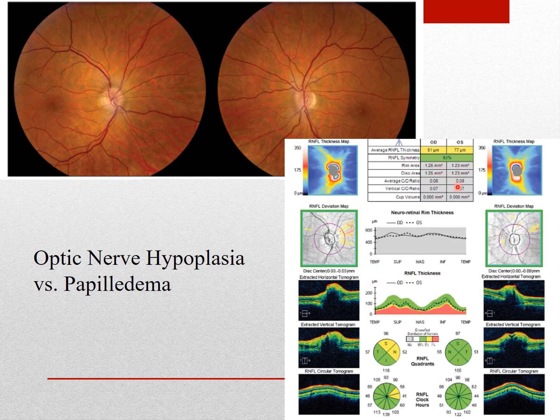Again, here, like I mentioned, everything's in gray, not enough data, because look at this, the disc is so tiny, insufficient data, everything's shaded in gray. Even the cups are tiny too, all right? So far, everything is pointing towards optic nerve hypoplasia. Look at the nerve fiber thickness. Perfect, this is following the double hump, there's no sign of nerve fiber loss. This is definitely optic nerve hypoplasia, no signs of swelling.